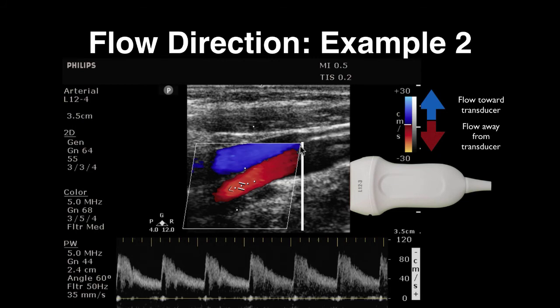Here we've got our pointer arrow. So we drop down our line from here. Again, if you forgot about the pointer arrow, just draw down a line from this corner of the top line and draw a line down here. The line that does not intersect the color signal is your reference line. So we put our imaginary transducer here.